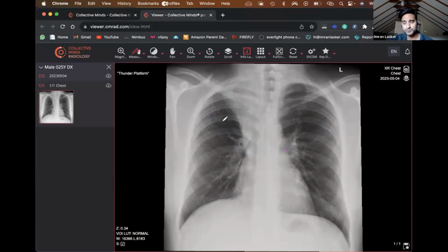So you could say one of the secondary indications, or supporting findings, of loss of lung volume or collapse of the left upper lobe and right upper lobe in this particular instance is that there could be a bit of crowding of the ribs on that side. Sometimes you get a bit of the trachea moving that way as well to compensate for some of that loss of lung volume. But again, on this one, we haven't seen anything like that.